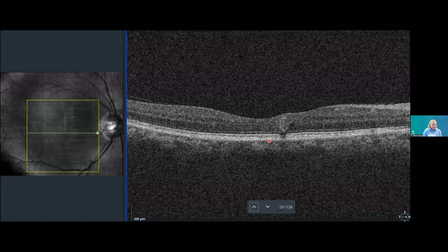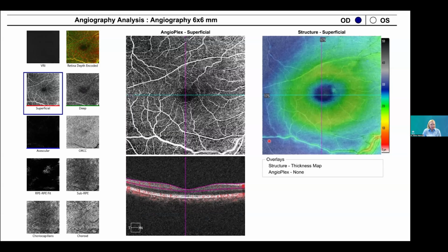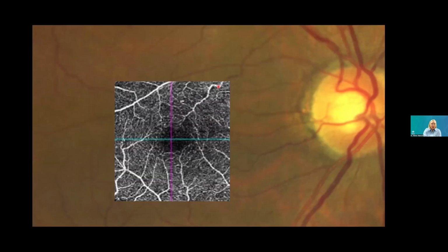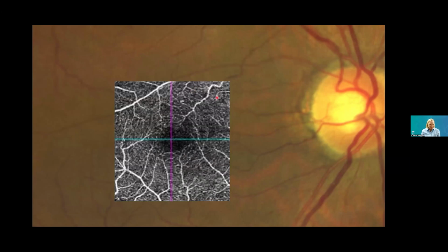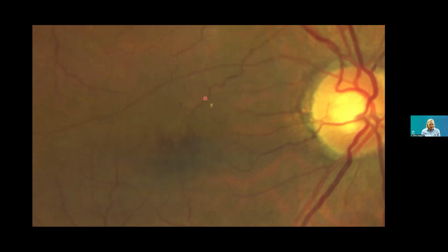This patient, we did do an OCTA, and you'll see that there are some areas of focal non-perfusion right off of the fovea. And of course, don't always only think of retinopathy as the reason why we might have non-perfusion, because if you maybe saw in the other image, maybe some of you caught it, this patient also has a Hollenhorst plaque. Now, I'm not sure this is actually causing any of this non-perfusion. It's certainly in the realm of that area, but this patient also has a Hollenhorst plaque.